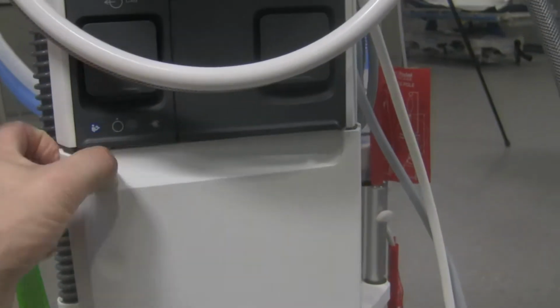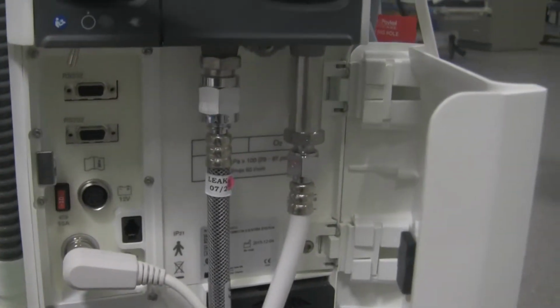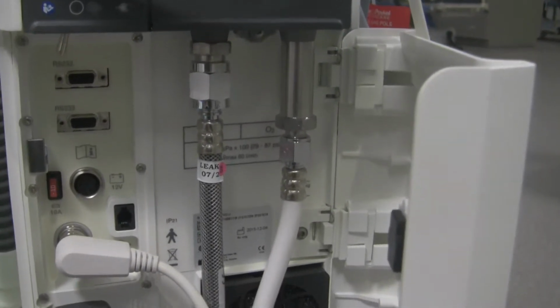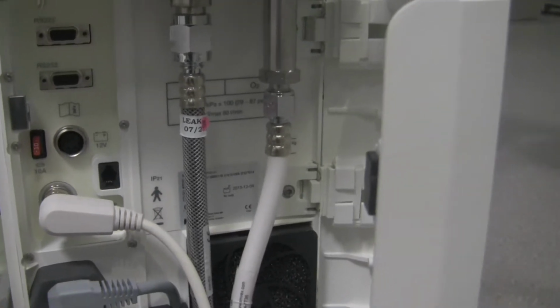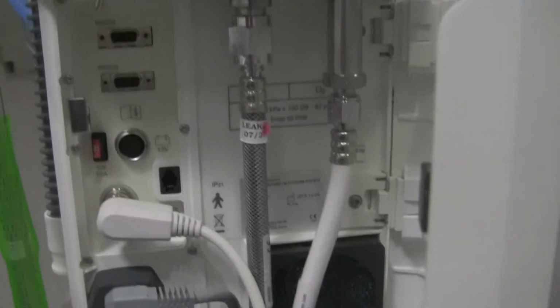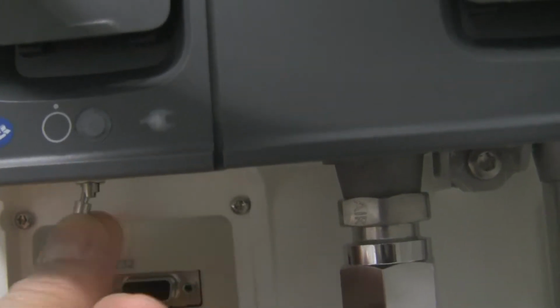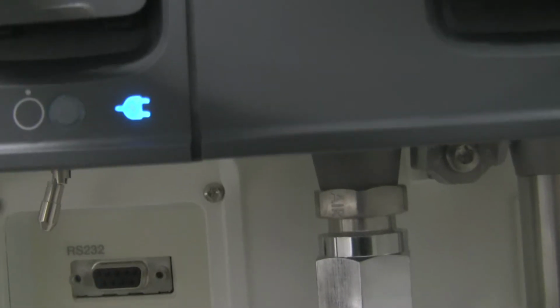Now on this ventilator, we open up this door. There's a bunch of stuff in here for extra things that you can have come into the ventilator or go out of the ventilator for different types of devices or uses. But the most important thing here is to find the on-off switch. The on-off switch is right over here. This is the switch that turns it on. You have to pull down and then turn it to the right for this to fire up and to start.